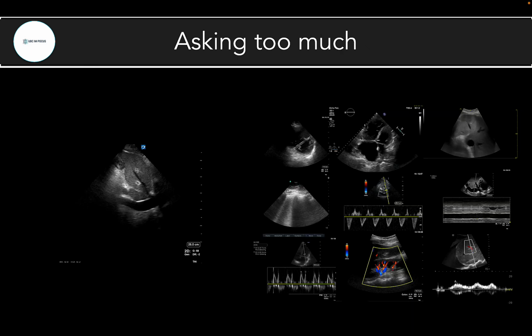Lastly, don't overestimate what the IVC can do. It cannot answer all of your volume-related questions. It is one data point, and you want to integrate it with all of your other POCUS and clinical data points.